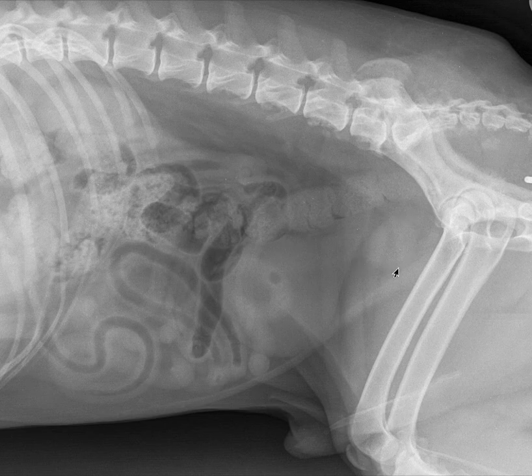For an intact dog, it's okay to see the prostate, but in a castrated dog like this one, I don't expect to see the prostate on radiographs at all. So this is extremely large. I also find the opacity to be mildly increased, especially given that the size is smaller than the urinary bladder, but the opacity is slightly greater. This may be partly artifactual due to superimposition of the thigh musculature.